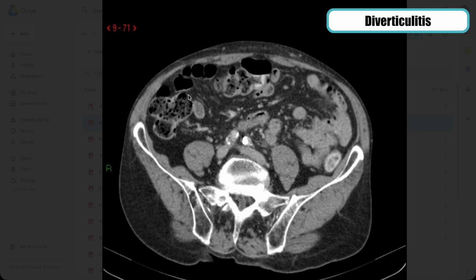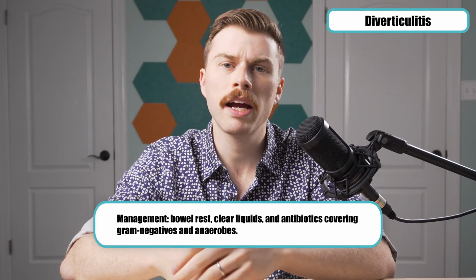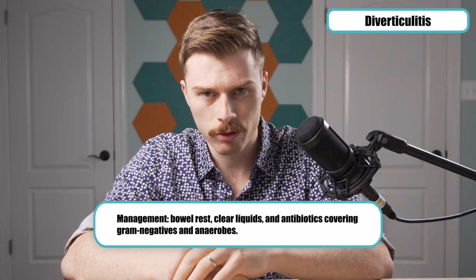So we're looking at diverticulosis, possibly even diverticulitis. Management includes bowel rest, clear liquids, and antibiotics covering gram-negatives and anaerobes yet again.